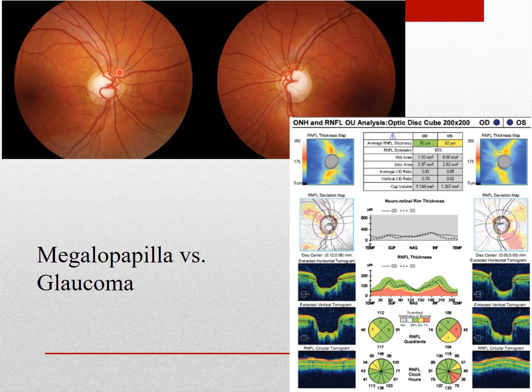You can see here how the blood vessels are entering the disc, right? You see how it is kind of to the side, everything shifted. So that's probably what is going on. There is a shift of the arcuate bundles, leaving one side thinner than the other. So that's why the machine thinks there is a loss there.